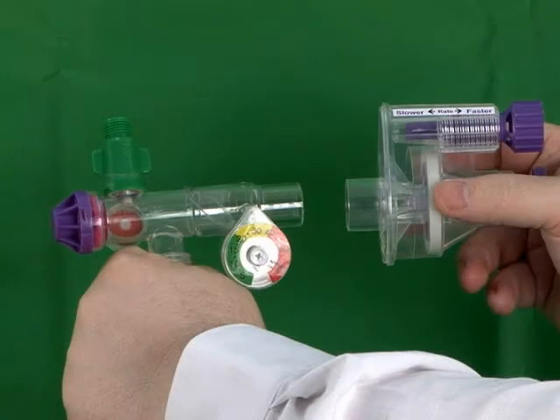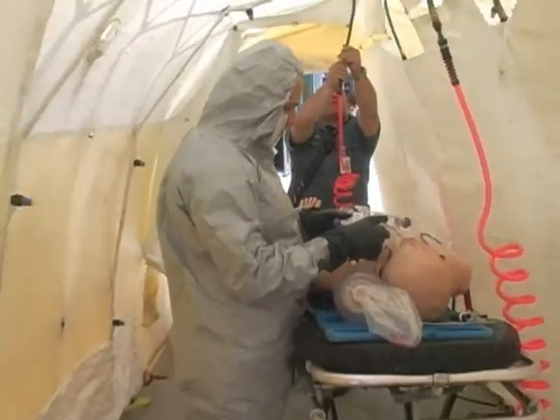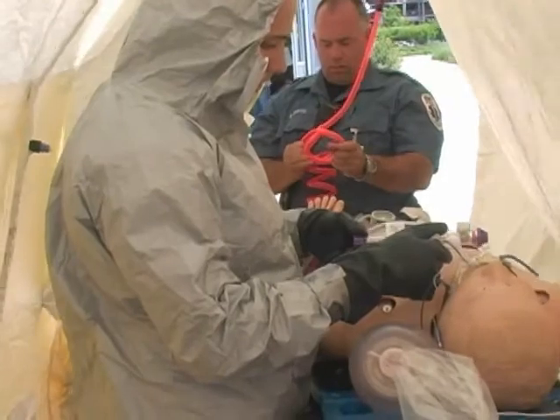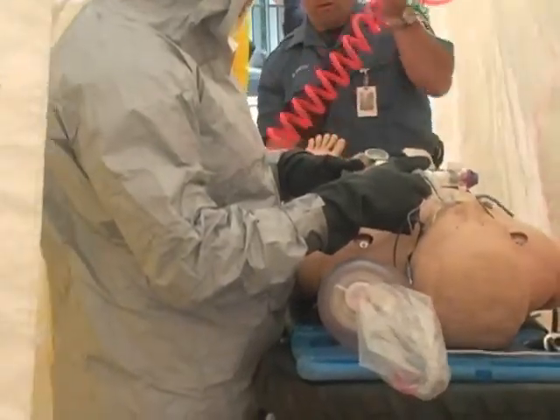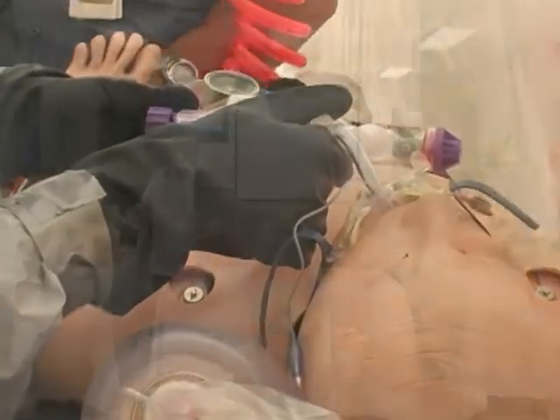In case of vomitus or severe patient secretions, first disconnect the modulator from the patient T and allow the gas flow to push the secretions out. Next, tap the modulator on a hard surface to clear and then reconnect it. If the modulator jams or malfunctions, the resuscitator is equipped with a redundant pressure pop-off valve which will activate at 60 centimeters. In the unlikely event that it malfunctions or fails to deliver support, or if the pop-off valve activates, discard the device immediately and provide another means of ventilation.